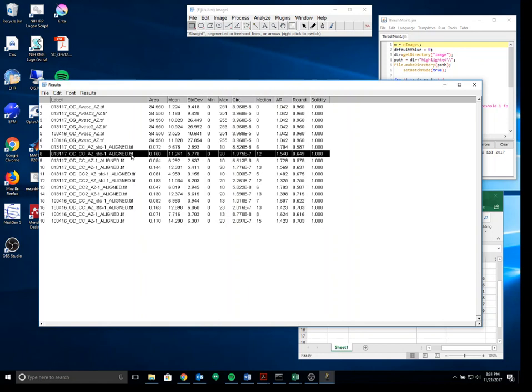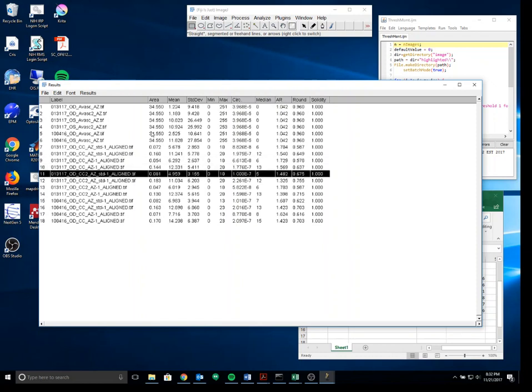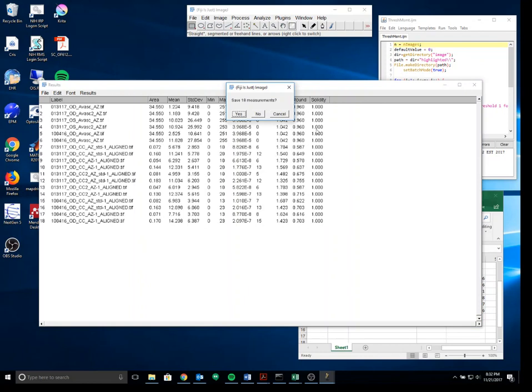As for which one is more clinically relevant, that I guess still remains to be determined. Much of the other values here aren't of any current clinical significance right now, neither the mean or standard deviation. But definitely this is how we get our flow void areas, and essentially this is how the algorithm is run. So hopefully that made sense, and yeah, so thank you very much for watching, and that's it.